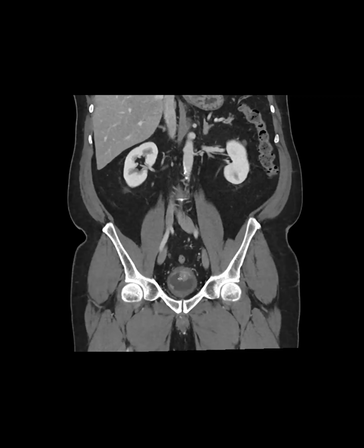We just actually switched from split bolus to a triphasic, basically nephrographic and excretory. Yes, I think the venous is essential, and there have been papers looking specifically at UCC, not the congenital or other causes of hematuria, but UCC. I think a third or a little bit more than a third are only detected on venous phase. That's correct. And then of course others are detected on urographic phase. And the types of lesions seen on venous are different from the lesions seen on urographic phase. So it has a complementary role.